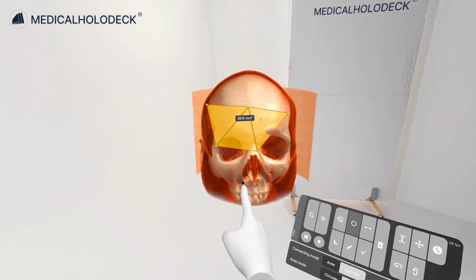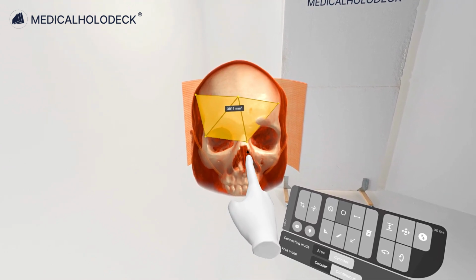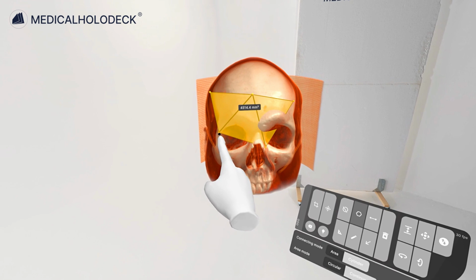Select one of the points to close the shape. The surface area will be displayed in square millimeters. The new shape can be adjusted. Aim at a point and hold the trigger to reposition it.